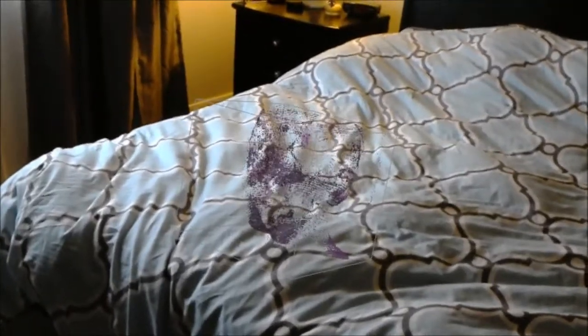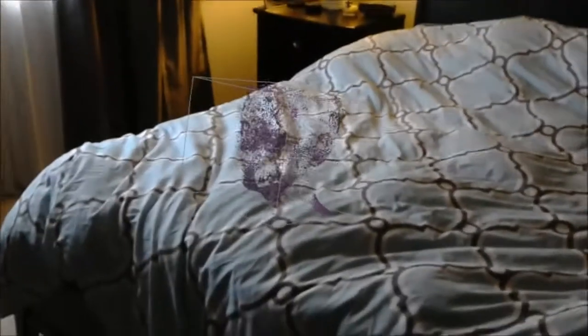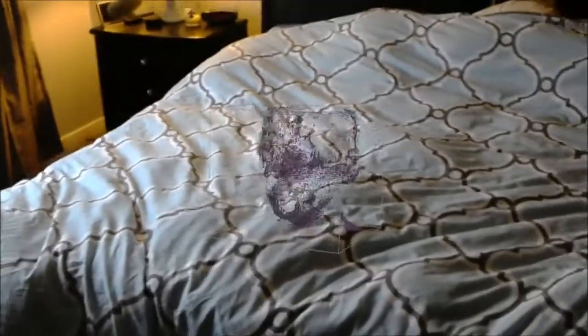The other way that 3D reconstructions are done in medical imaging, and the way that they're mostly done now, is with ray casting. That's the kind of isosurface reconstruction where you get almost instantly a representation of the surface that's useful. So that would be the next step to implement on the HoloLens. But for now, we've got an implementation of the marching cubes algorithm.